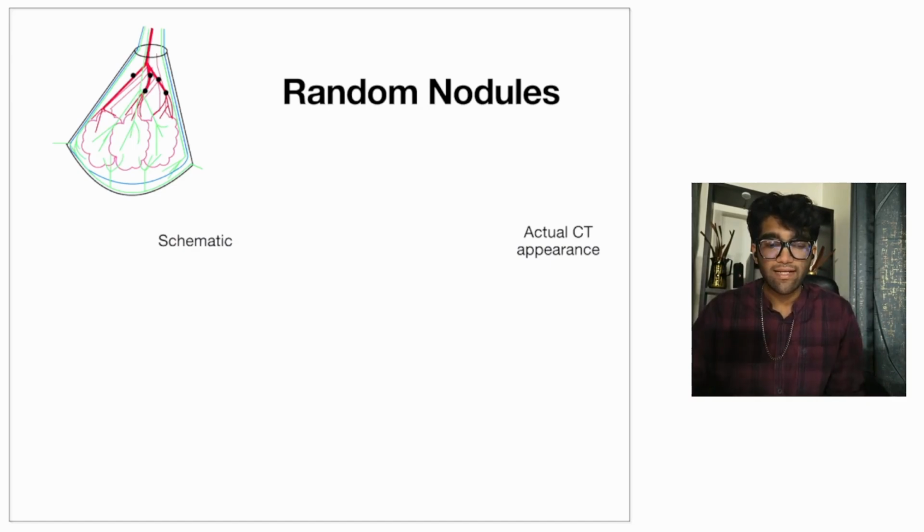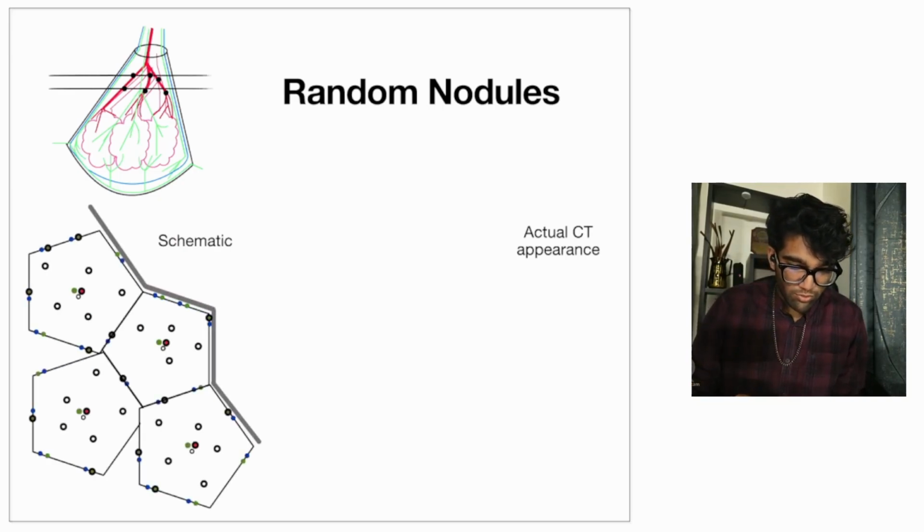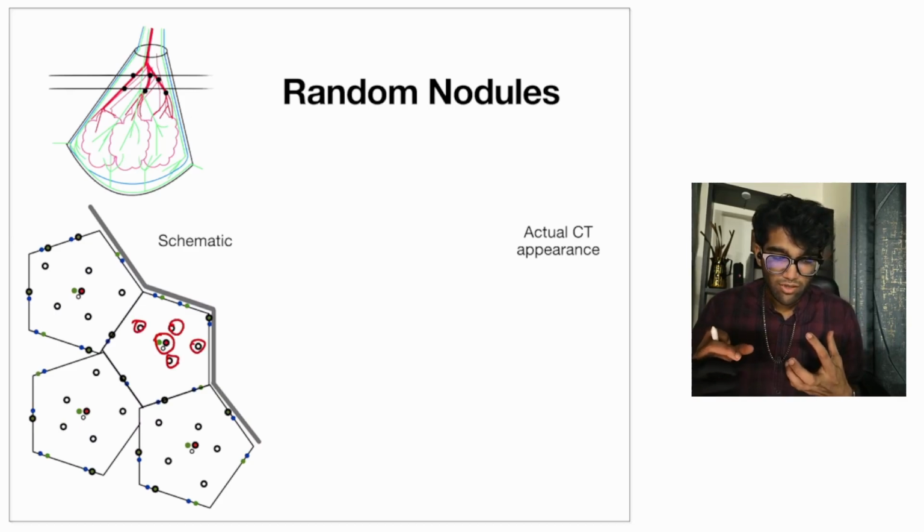Because they maintain a certain distance, I call them asocial. They are introverted, much like me. So they try to avoid each other. So we end up getting these nodules. We get a centrilobular pattern-like nodule in the center, but you also get similar nodules nearby, not clustering together.